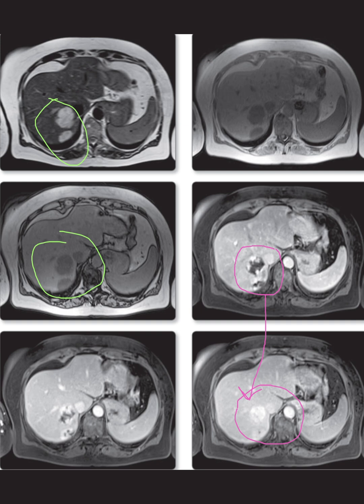Cavernous hemangiomas are quite common benign liver lesions and are often discovered incidentally during imaging for other reasons. They typically appear as well-defined lesions with high reflectivity on ultrasound located in the periphery of the liver. On CT and MRI, they often show a distinctive filling-in pattern from the periphery towards the center on delayed phases, consistent with benign features. Now, it's important to discuss why we reach this conclusion and what other factors we consider.